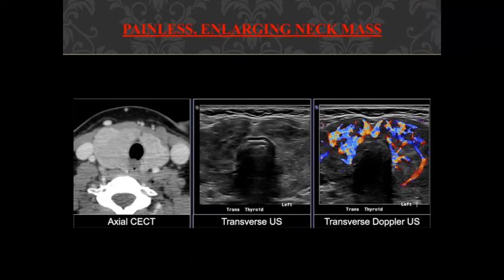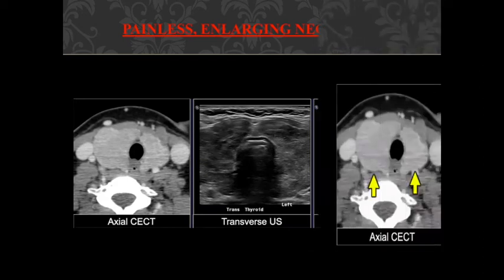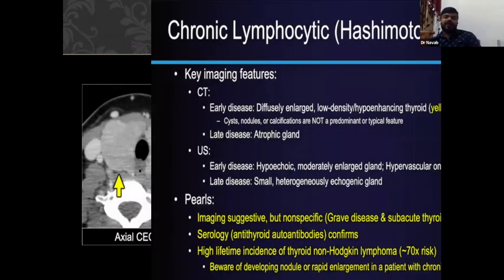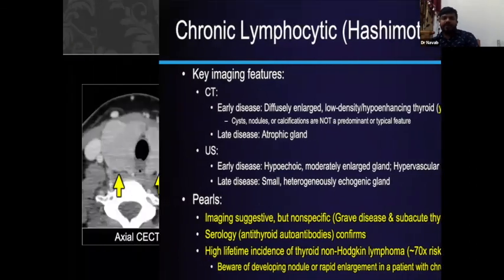Yes. So bulky bilateral thyroid gland with micronodularity with multiple fibrous strands in it, right? Yes, sir. So it's a case of chronic thyroiditis. Okay. These are the imaging features in early cases. So how do you differentiate it from Graves' disease?